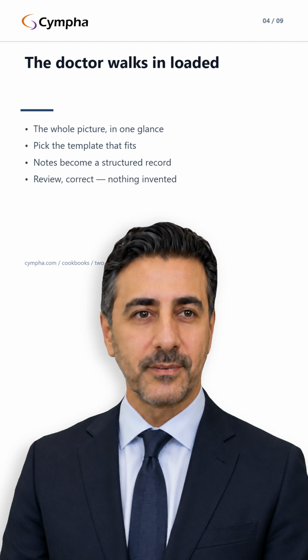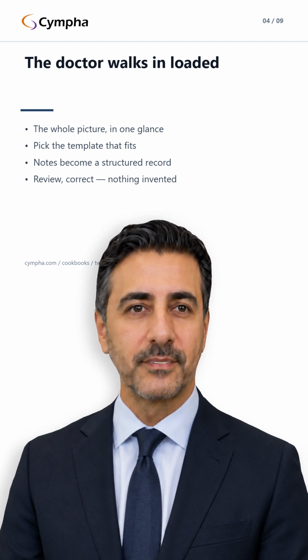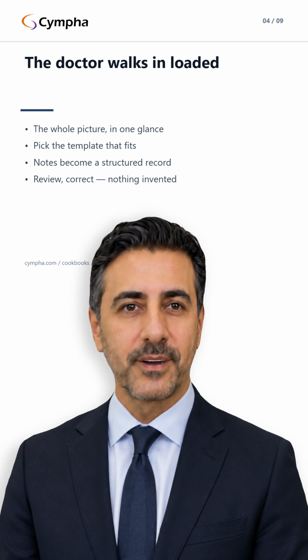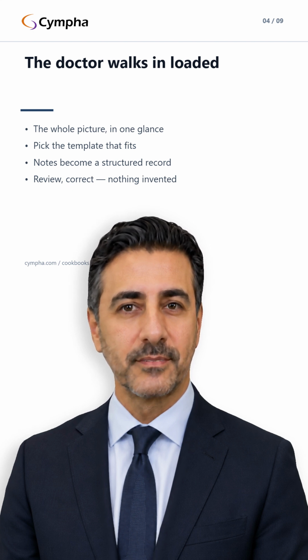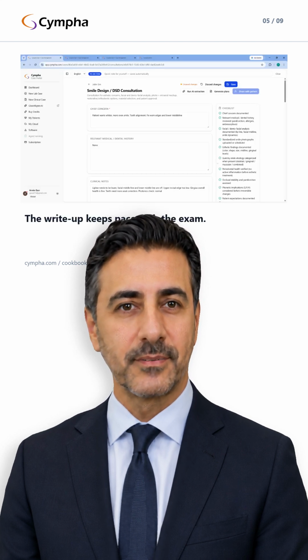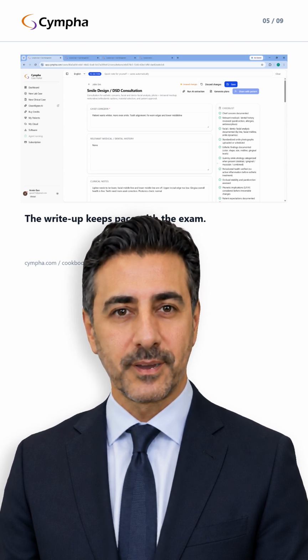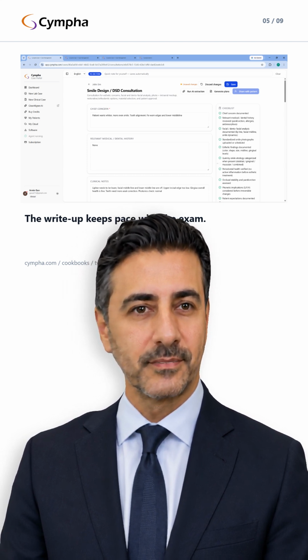They examine, pick the template that matches the case, and speak, typing as they go, or letting the assistant scribe. Then one pass reads what they wrote and organizes it. Tooth-numbered findings, diagnoses, options. It never adds anything the doctor didn't say. The doctor is doing diagnosis, not data entry.